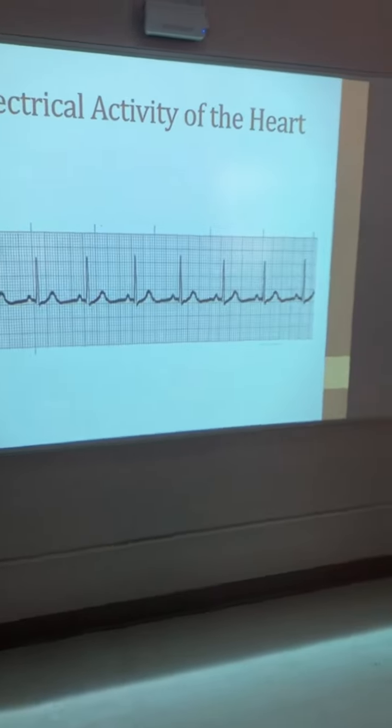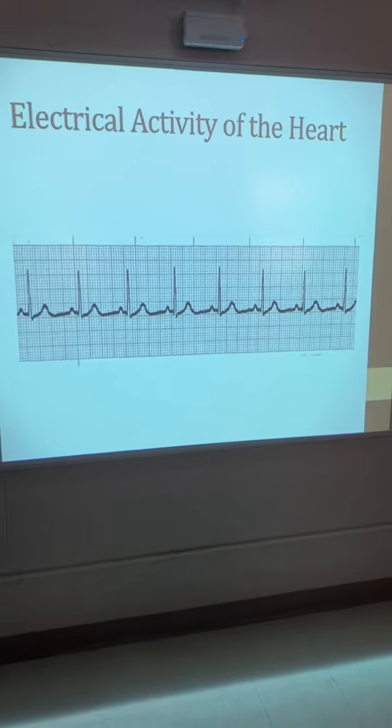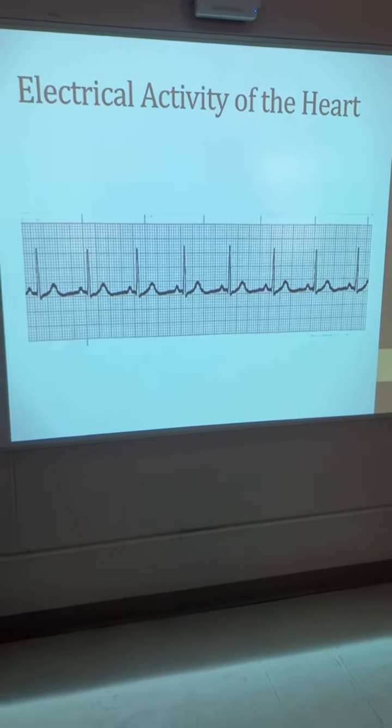This is part 2 of how to read cardiac rhythms. I want to show you that it's not as hard as you think. So the very first thing is we start out with a 6-second strip. Whenever you see these, you need to think these are 6 seconds.